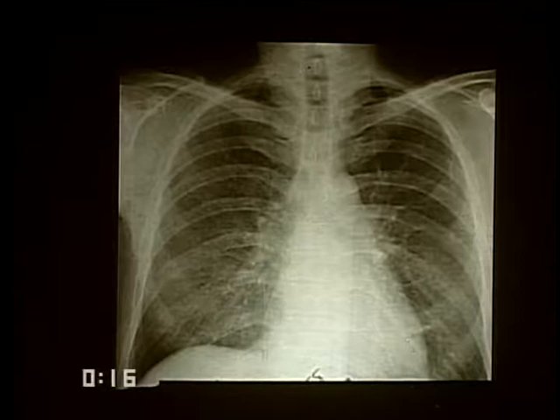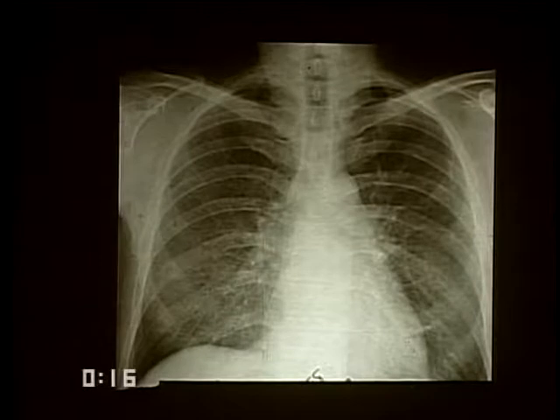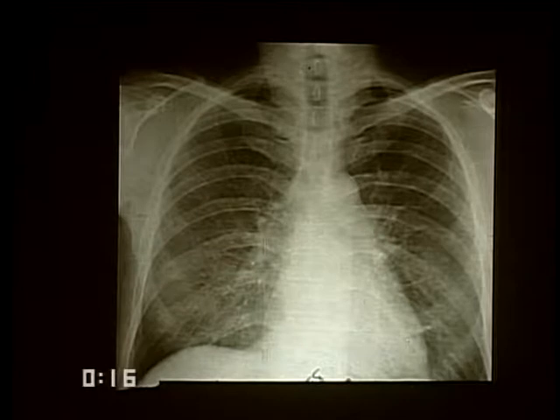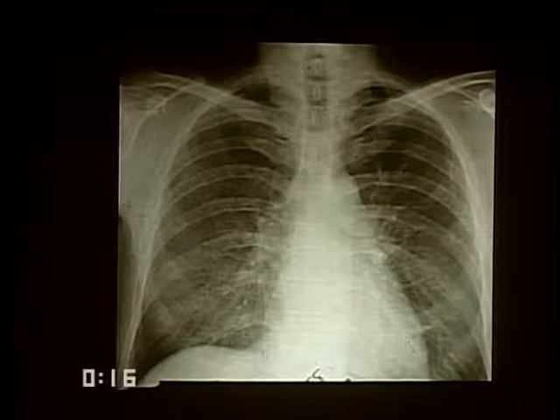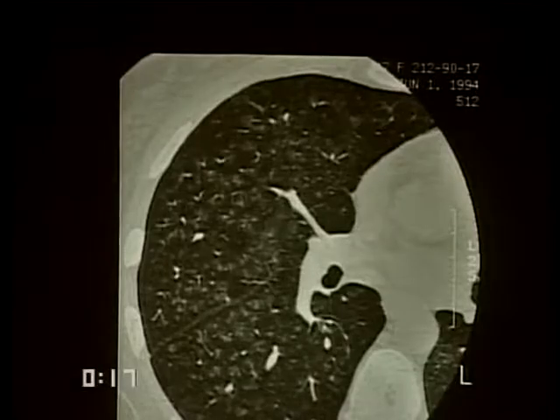Extrinsic allergic alveolitis, or allergic pneumonitis, is commonly missed in my experience, because I commonly miss it, which is why I say in my experience. It is a very hazy opacity. It tends to be in the center of the lung, and on high resolution CT one can again appreciate that it tends to be in the center of the lung, but its appearance varies by its severity.